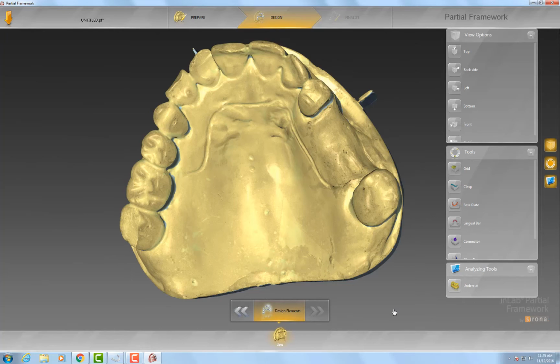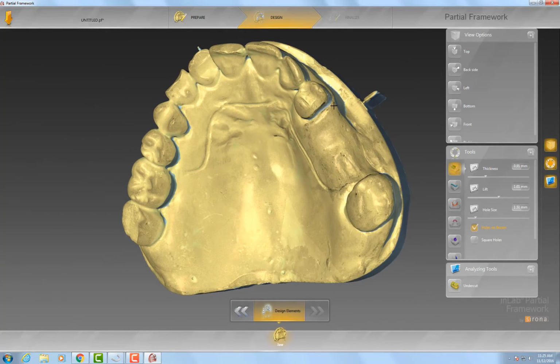Now keep in mind, this design we're going to be doing an actual metal frame, so I'm going to be doing a little bit more in detail, and then after I go to manufacturing the frame is when I'll actually explain to you how this can all start really adding to money. So the first thing I like to do is I like to add all my little accessories. So the first thing I'm going to do is I'm going to add my grid. It's a little too far.